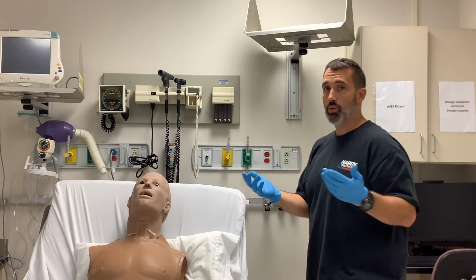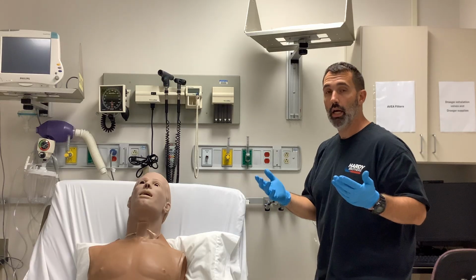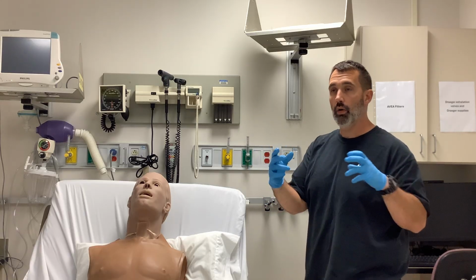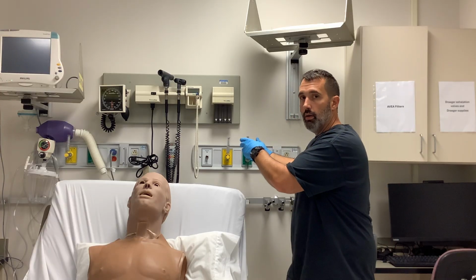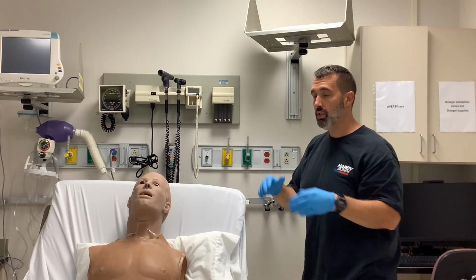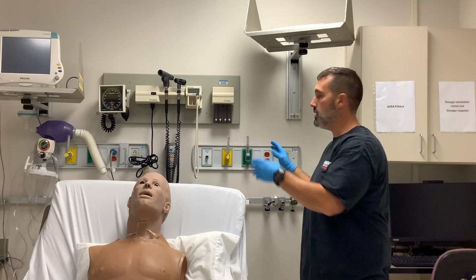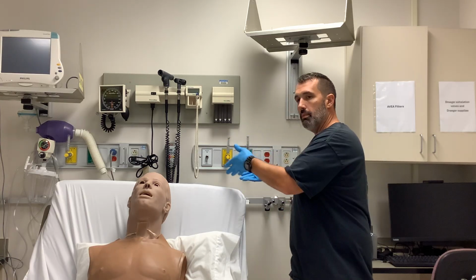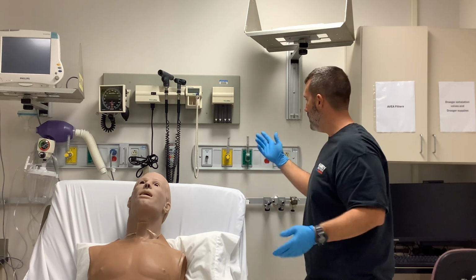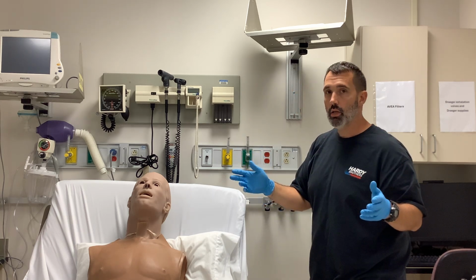So all I did was take a knowledge of the air to oxygen entrainment ratios, apply them to this setup here, and I'm able to blend my own system. The purpose of me setting it up like this is so that you can actually see air and oxygen mixing together. So that's how the air entrainment stuff works.